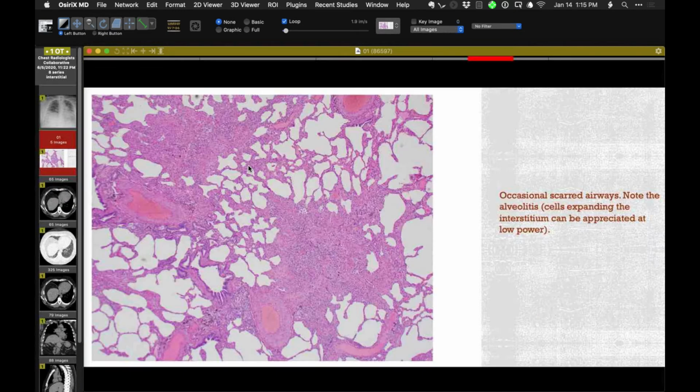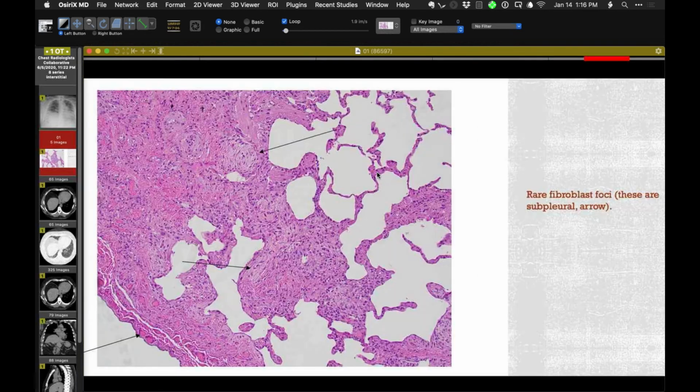This one, again, I really have nice labeled images for you because this has many findings consistent with fibrotic HP. So here the arrows in this section show numerous loose, non-necrotizing peri-airway granulomas, an image showing granulomatous inflammation, and remodeling of airways with what the pathologists call peribronchiolar metaplasia. Here's an image showing a nice interstitial granuloma. Here are some scarred airways.